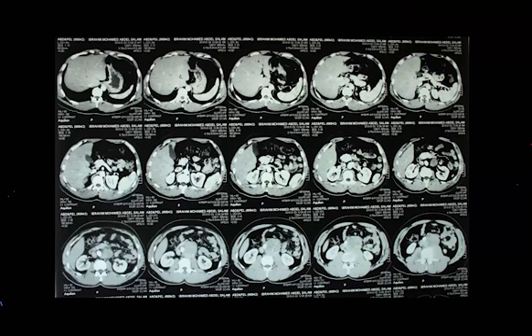Contrast enhanced CT abdomen axial cuts. Okay. There is a region here displacing the aorta, and it is heterogeneous. It looks very similar, exactly, heterogeneous. It's the same. What is it again? Lymph nodes. Lymphadenopathy, exactly. Okay.